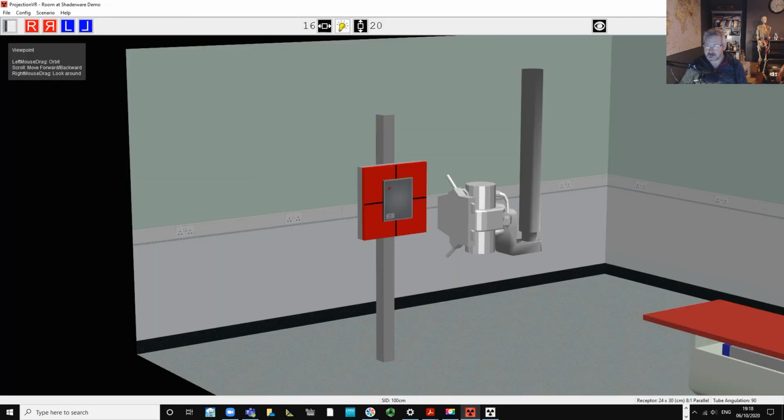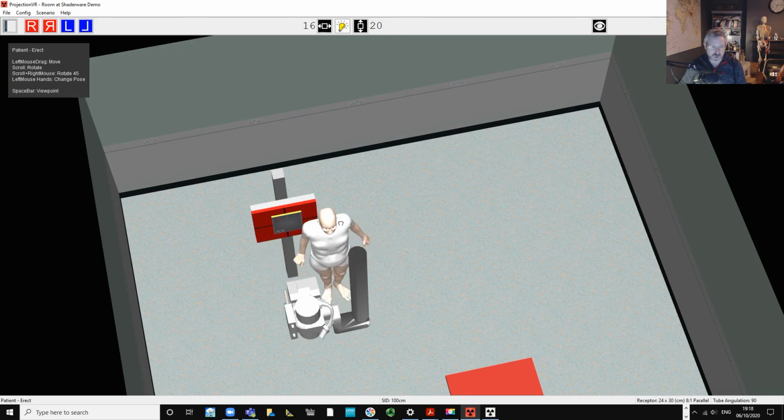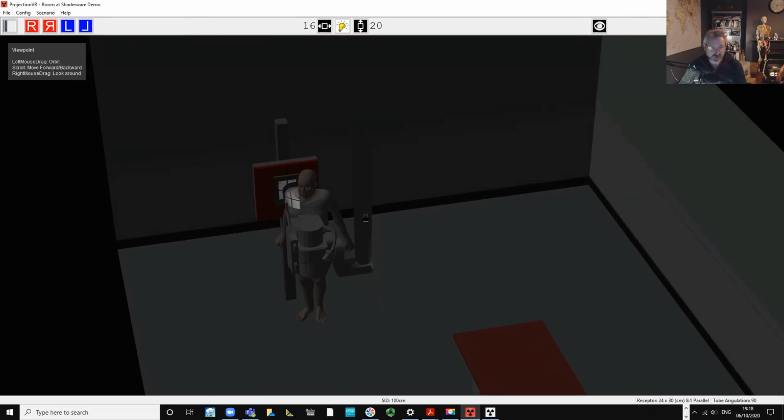Okay, so now we go back into the room. We bring our patient back in and explain to them that we need to do another image. Obviously, the patient can sometimes say, why? Is it something serious? So you have to reassure the patient again. I'm just turning her a little bit more steeply this time than I had before. I have to memorize where I had her before.